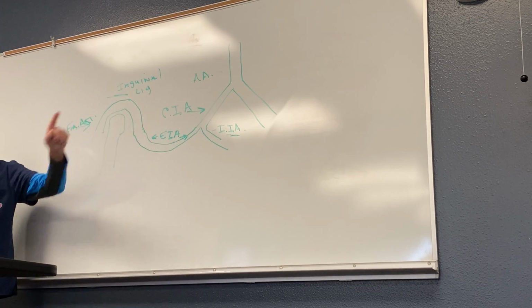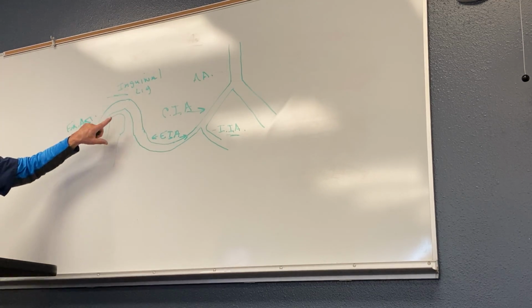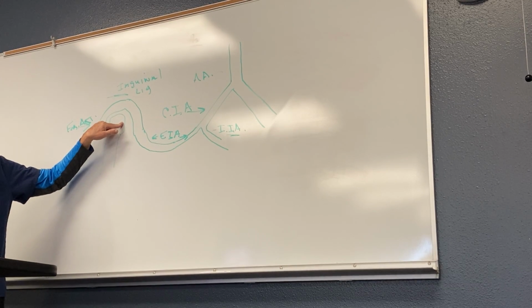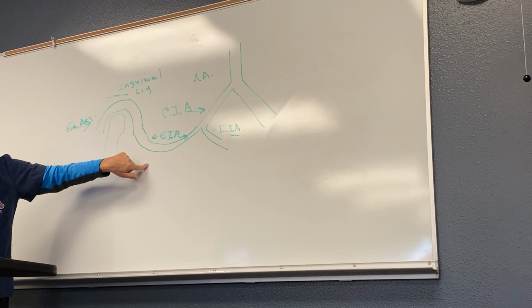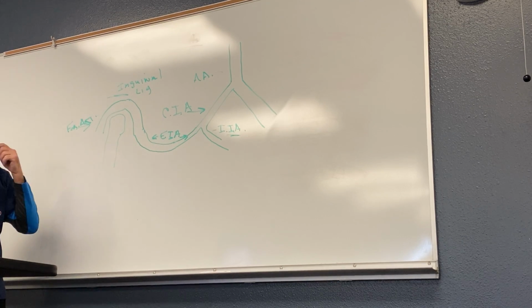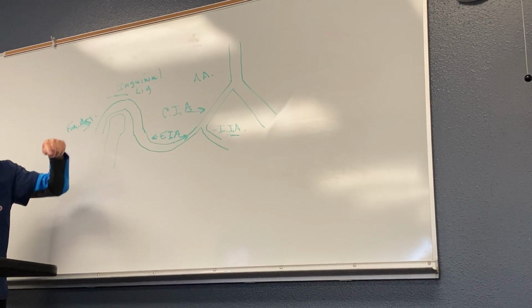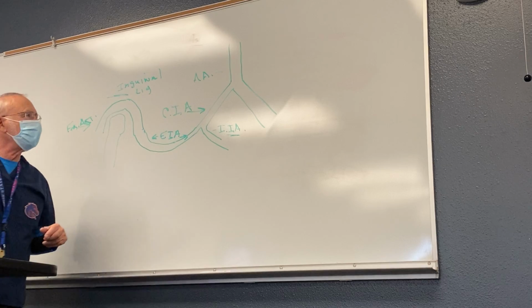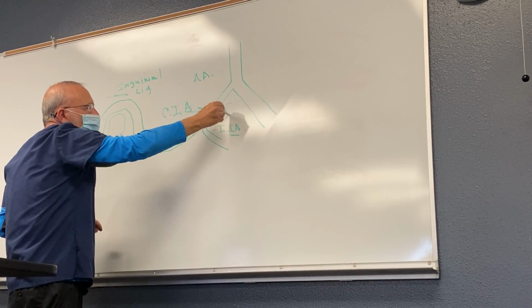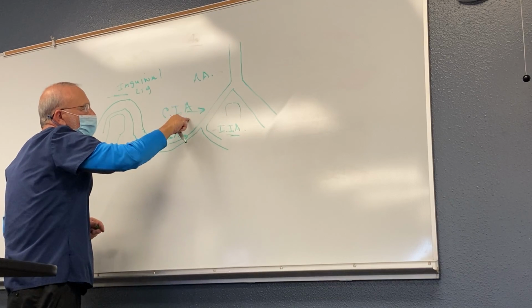So typically we can't see the inguinal ligament, but when we see the femoral head, the general understanding is that the transition has occurred from external iliac arteries into femoral arteries. So that's the landmark or benchmark we're going to use, and from that point down we'll get into extremities later on.